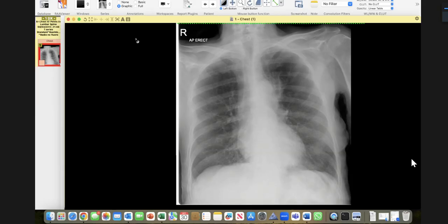She's complaining of cough, right? Yes, and weight loss. So I'm re-examining the lung parenchyma. Maybe there is a bilateral reticulonodular pattern. Look at the ribs once again. Okay. These are the posterior aspects.